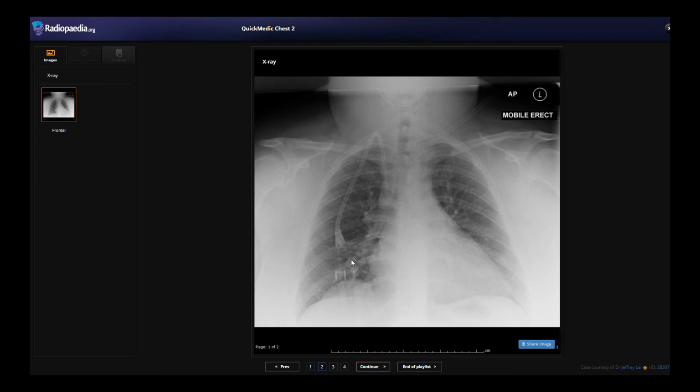So let's have a think about what's going on in this chest x-ray. The first thing we look at is the airspace, so we look at the airway. You see it's bifurcating nicely there, and going around, the pulmonary markings look all okay. Around the sides, this looks abnormal, right? Mid and lower zone opacifications there. It looks hazy, certainly. Nothing really there.